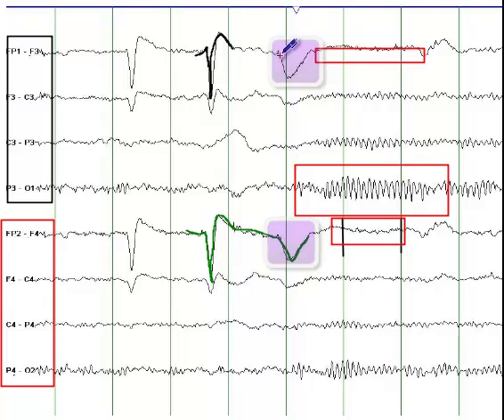This again, here, this is eye closure. Eye closure artifact is seen in the frontal regions because that's closest to the eyeballs. And as soon as the person closes the eyes, you see alpha frequency appear in the occipital head region. This is an example of a normal EEG.